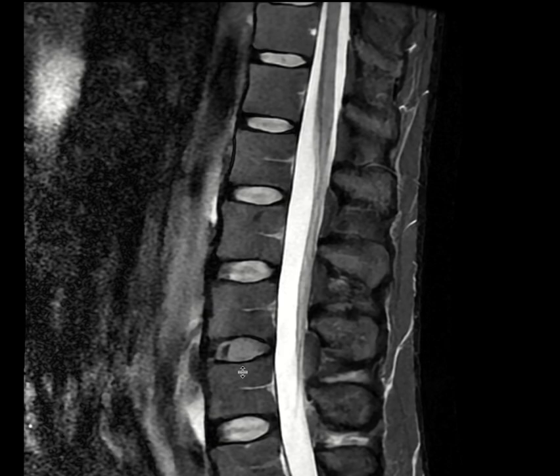So if you have anything like a fracture, edema, or some sort of marrow replacing process, it is going to show up as STIR bright in the vertebral bodies. Just remember that. So this is the normal appearance of the STIR sequence: the spinal canal, vertebral bodies and soft tissues are all dark, except the spinal canal with CSF, which is bright.